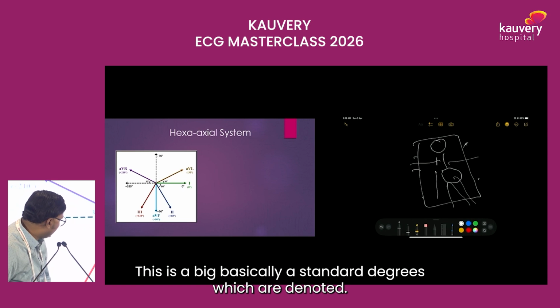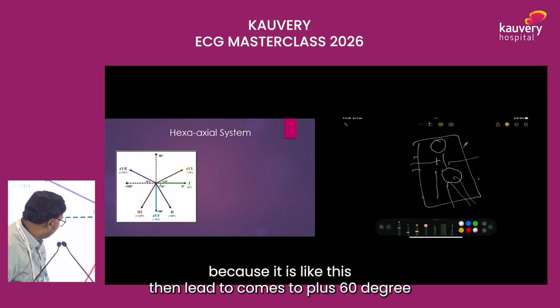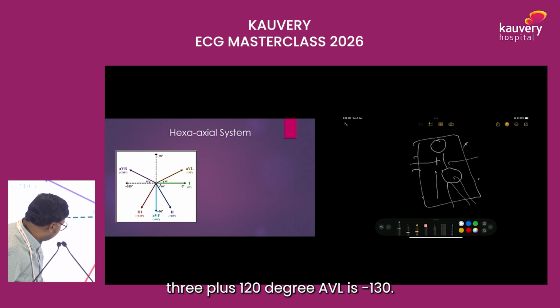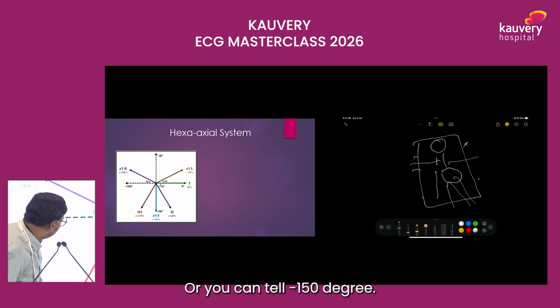You remember this, the degrees are basically standard degrees which are denoted. So lead 1 is termed as 0 degrees, because it is like this. Then lead 2 comes to plus 60 degrees. AVF, because it is towards the foot, is plus 90 degrees. Lead 3 is plus 120 degrees. AVL is minus 30. When we go anticlockwise from this, it is minus. And AVR is either plus 210 or you can say minus 150 degrees.